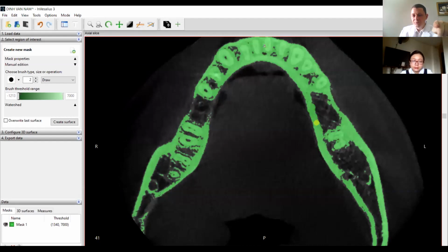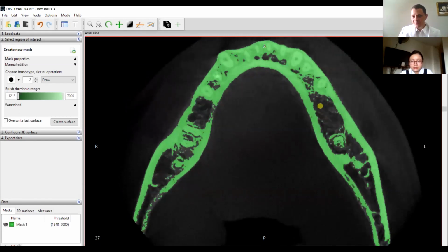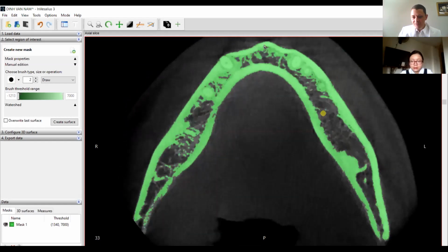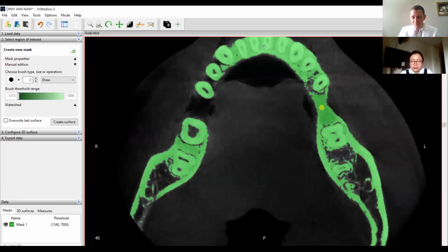And by the way, this usually you cannot do on the professional software. I mean, the one I have, I can sometimes export an STL file, but you don't usually have this function. Okay, so here you see normally on one side I should have my bone, and not on the other.